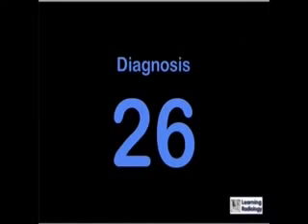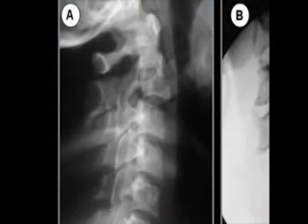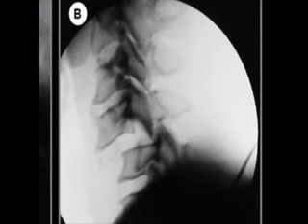Two different individuals who fell, injuring their neck. Why is it unwise to move either of them? First we'll look at A, and now we'll look at B.